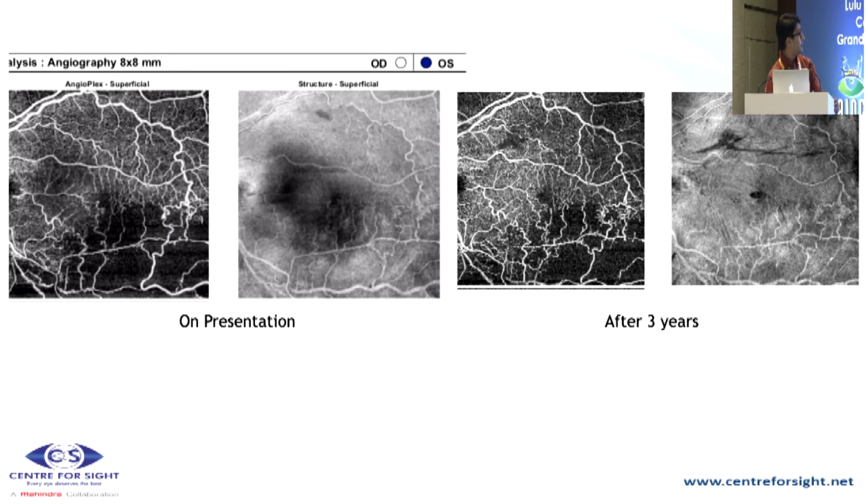And in 3 years, what we see is the presentation: the macular ischemia and the collateral vessels. After 3 years, these areas are still there, but what we see is this line on the structural scan. This is the formation of ERM taking place in this patient, and you see this dragging of the macula. Still, the patient is maintaining 6/12 vision, and she doesn't have any major visual complaints.